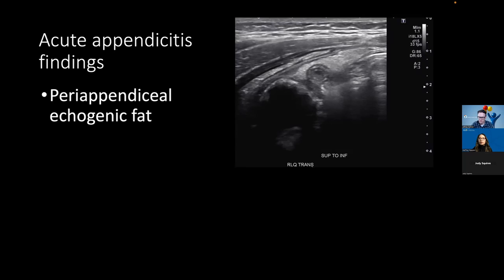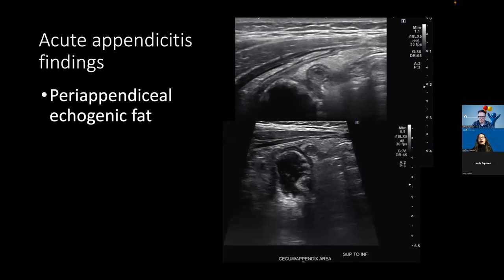At my prior institutions, we had GE, and this is classically how it looks with the linear probe. However, now I have Canon, so I'm curious to know if anyone else has experience with Canon. I feel like you have to tweak the settings a lot more.